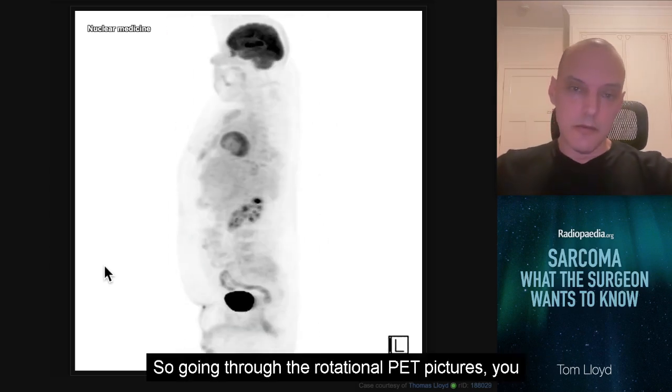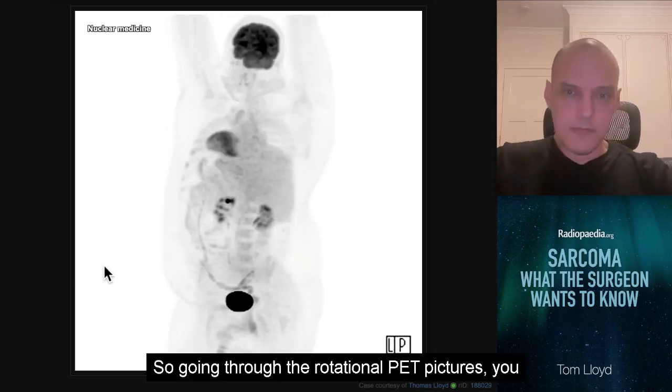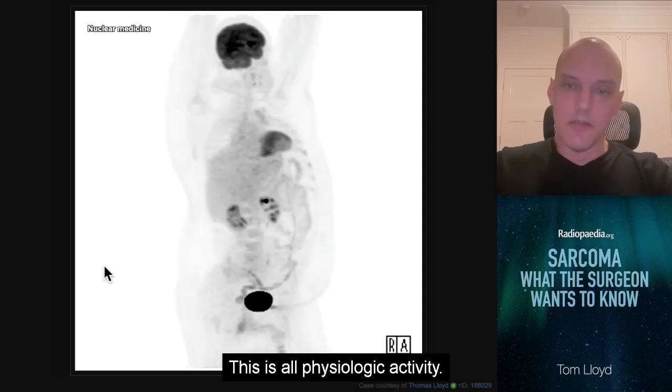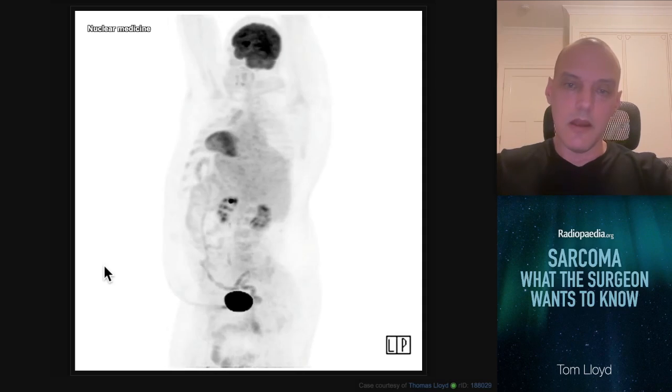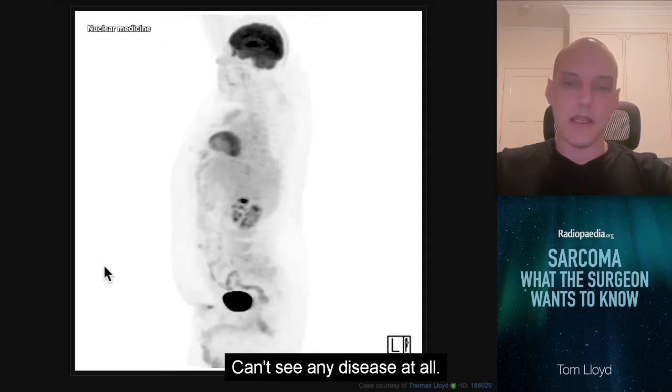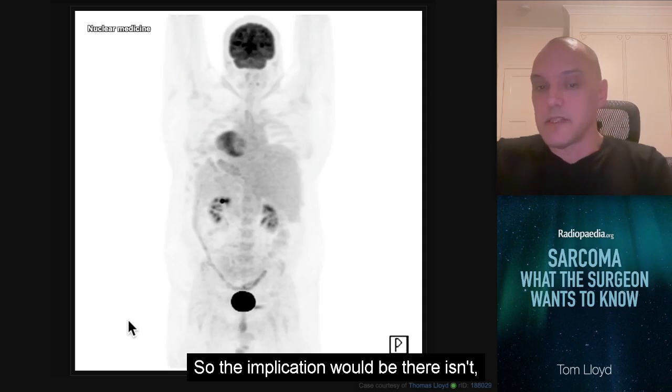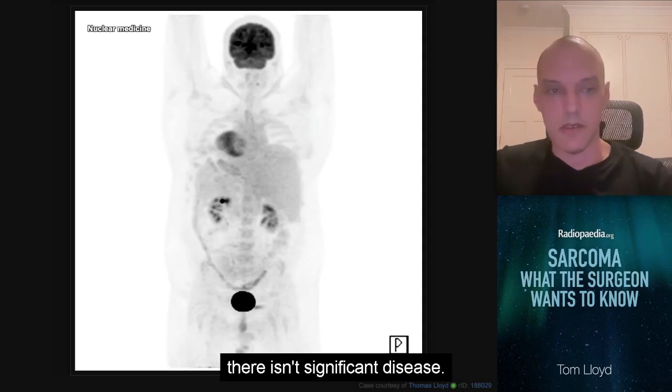So going through the rotational PET pictures, you basically see nothing. This is all physiologic activity. Can't see any disease at all. So the implication would be this: there isn't significant disease.